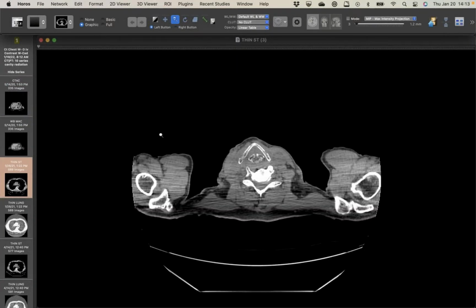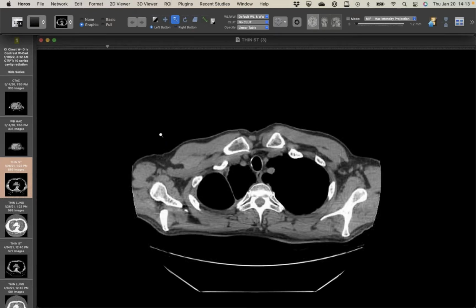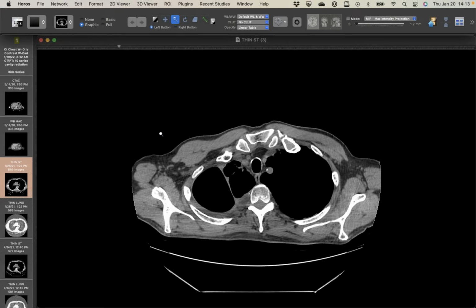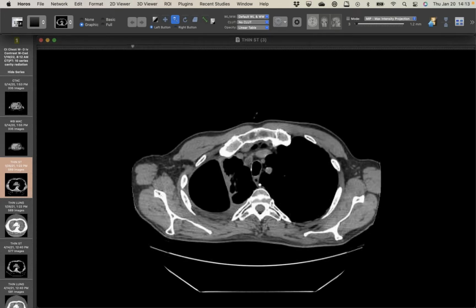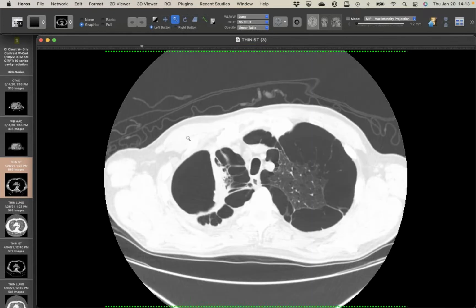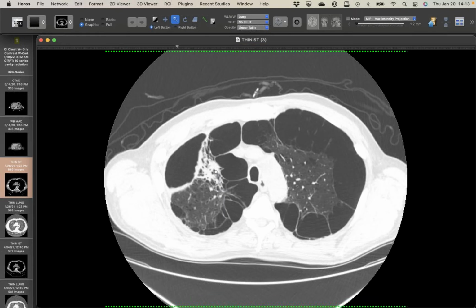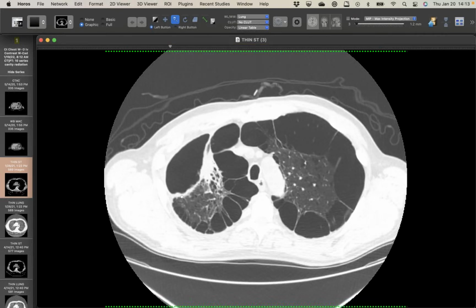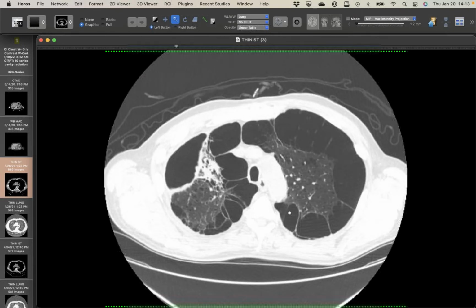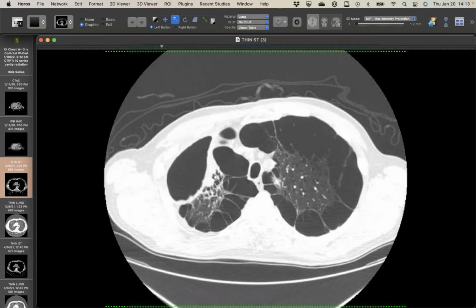So the patient was treated with definitive chemoradiation to the right lung, radiation because of the tumor and lymph node, but also chemo because of the lymph node involvement, was not a surgical candidate. And so got radiation to the mediastinum, right hilum, and this upper lobe lesion. And over time, I'm going to show you how this cavity has changed. This very interesting paraseptal emphysema as well, but the cavity had predated the cancer diagnosis.